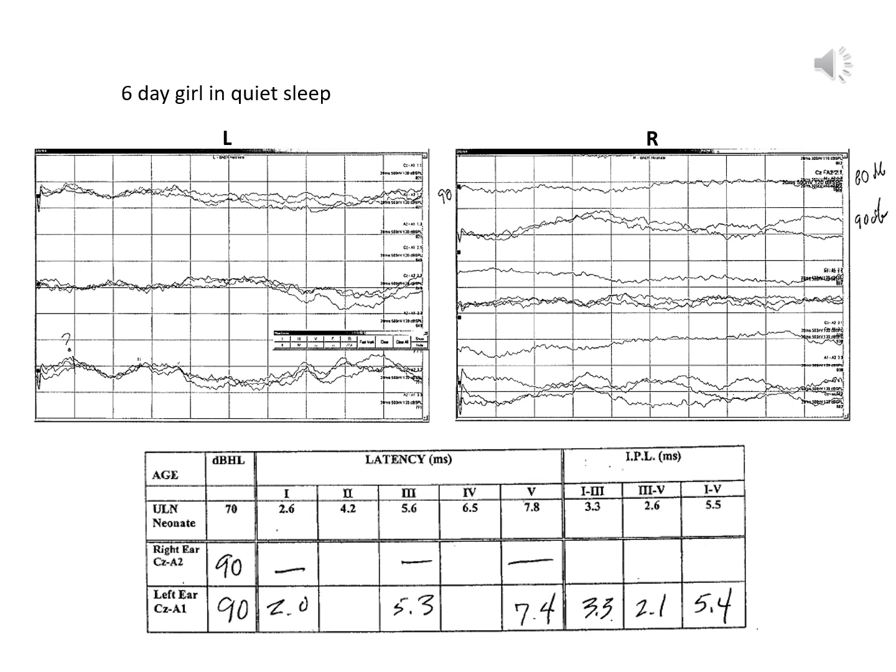And so the interpretation of this is that there is probably a hearing problem because there's no wave 1. And so when there's no clear wave 1 or a very poor wave 1, it's very difficult to interpret the other waveforms and to interpret interpeak latency. And so from this study, our overall interpretation would be an abnormal study, query hearing loss due to absent or poor wave 1.